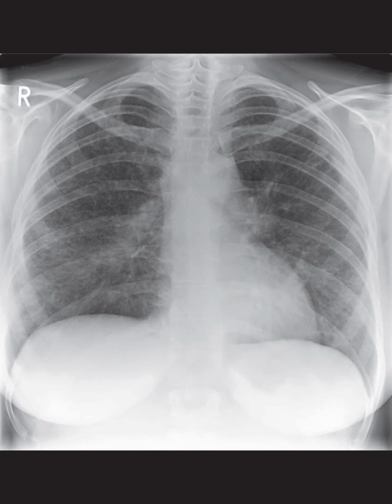To get a better handle on what's going on, I'd recommend a high-resolution CT scan of the chest, especially if this is the first time the patient is presenting with these symptoms. It'll give us a much clearer picture of the lungs and mediastinum, helping to confirm our suspicions.